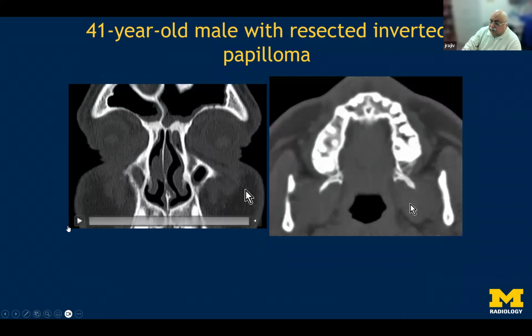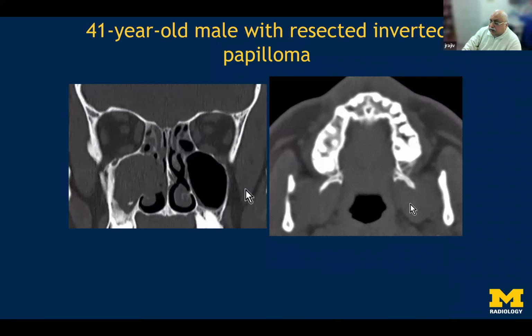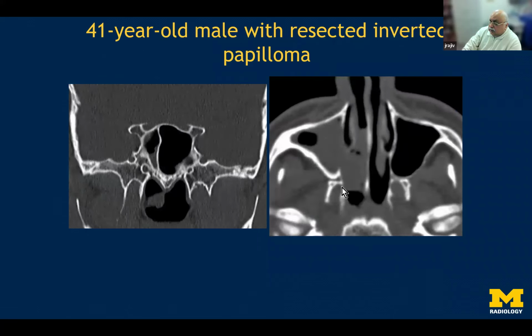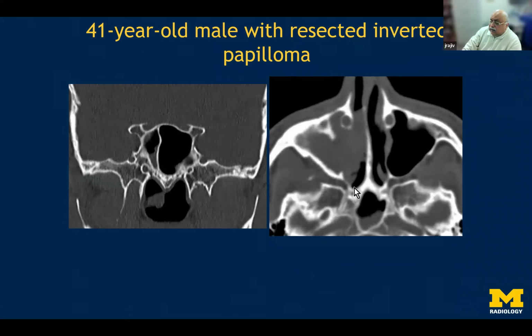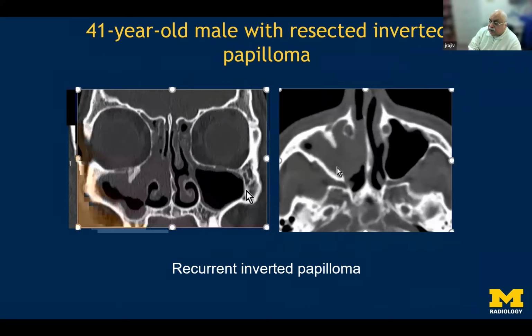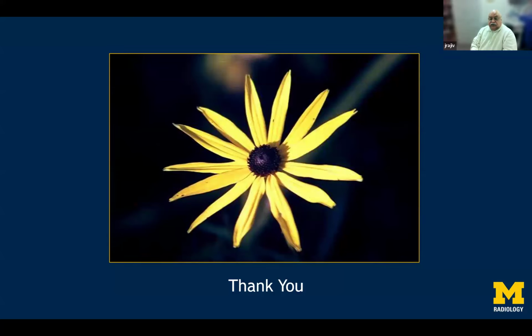The other important aspect of imaging is the localization of the areas which are important. I'm just re-stressing the role of looking at abnormal alterations in the morphology and then comparing it with the pre-op situation to make sure that we remove the entire abnormality in total.